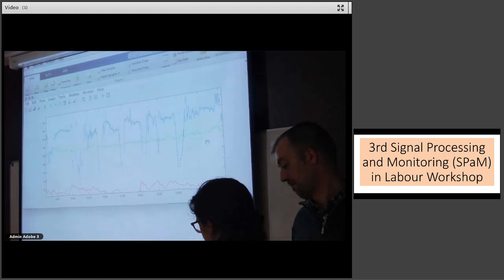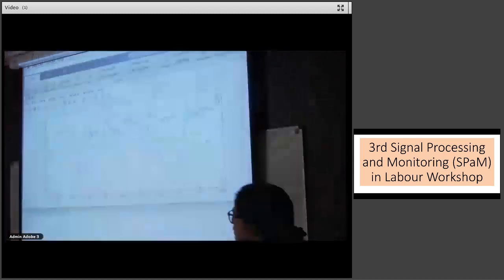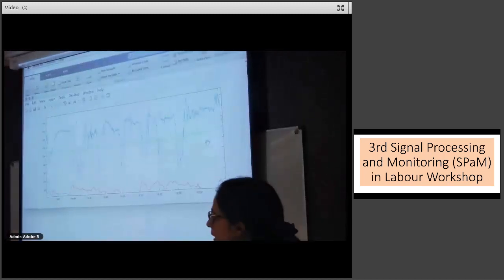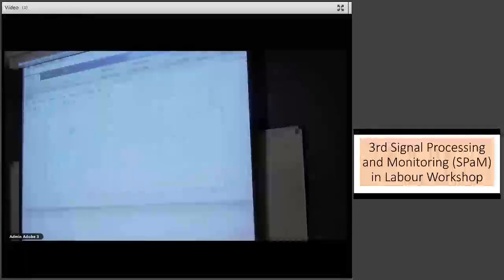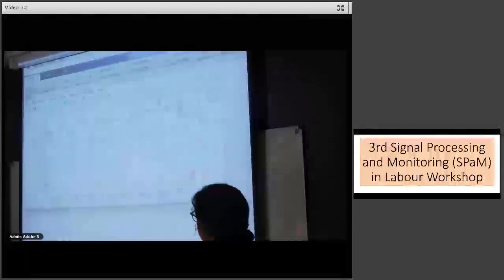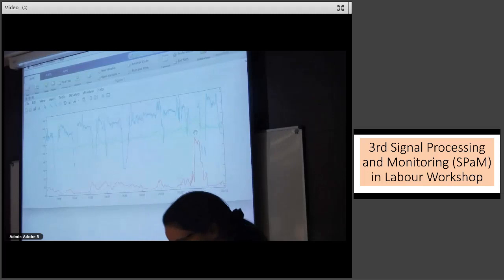I'm personally concerned, one, about the high baseline after recovery, or at the time of recovery, and the fact of how long it takes the baby to recover after the deceleration. That's over a minute to get back to baseline. Is that increased variability after, or just normal variability? Okay. But that's the nature of variable decelerations. They're inconsistent in terms of their amplitude, their relationship with the contraction, the duration.